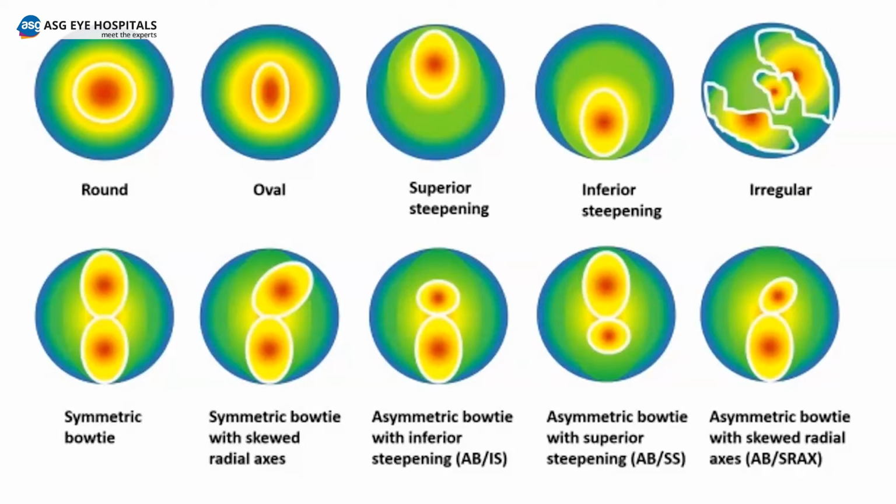So can a skewed axis come in a normal patient? Yes, skewing can be present, but the degrees of skewing might be less than 21 degrees if it is normal. Supposing it is more than 21, can anything go wrong with the scan, the way the scan is taken? Yes, definitely. What can go wrong? It's not being taken from the center.